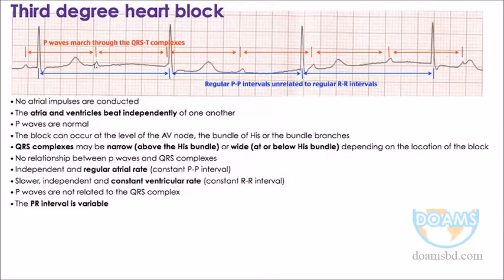Then look at that. Where is the P? This is challenging. It could be the P, it should be in our mind, because it is wrongly placed here. If you are confused, just keep your suspicion here, then measure the distance from this up to another P. Interestingly, you will find that this distance is equal to this distance. Then you will understand this is the real P. As we discussed, P can be inserted in any place of the tracing. So this is the complete heart block.